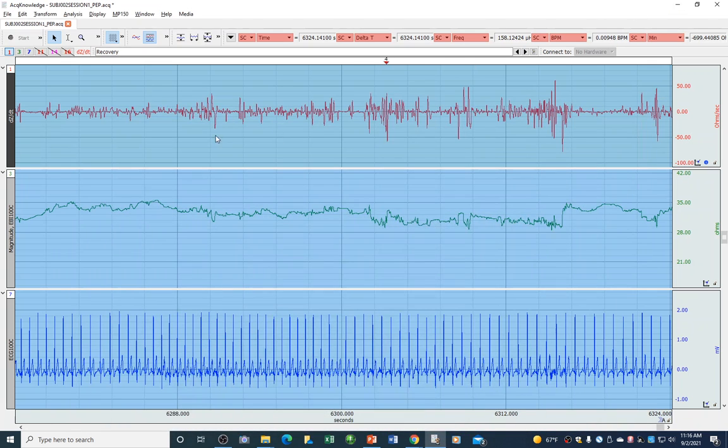Okay, picking up with where we left off, I've actually shifted to a different specific file we're going to be working with, because the one I started demoing on had a worthless DZDT signal. So we'll pick up here. We've just created the DZDT channel.